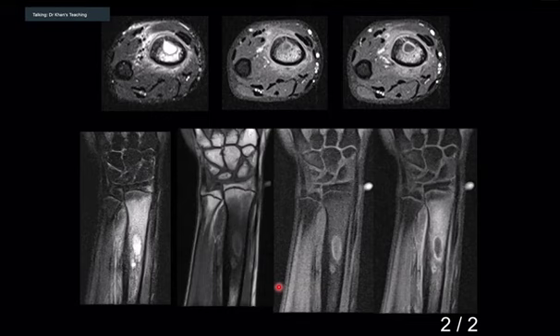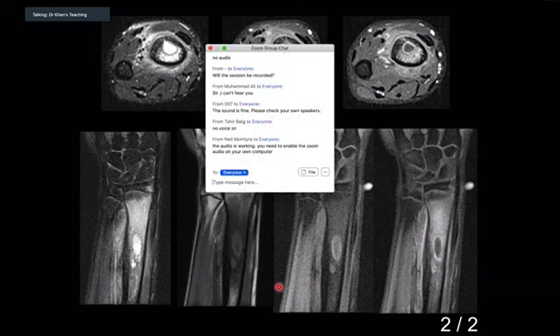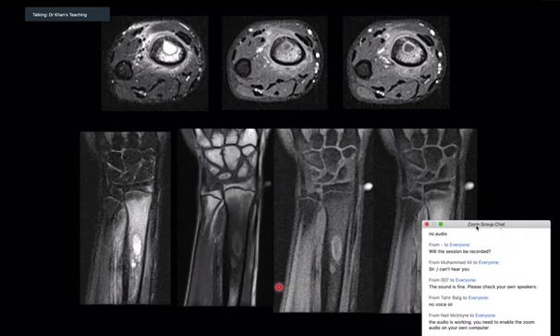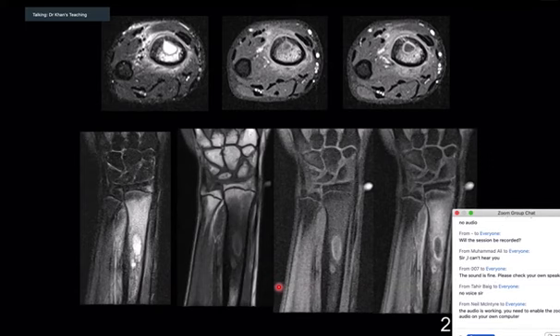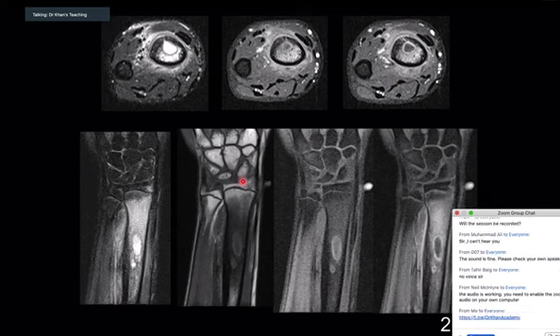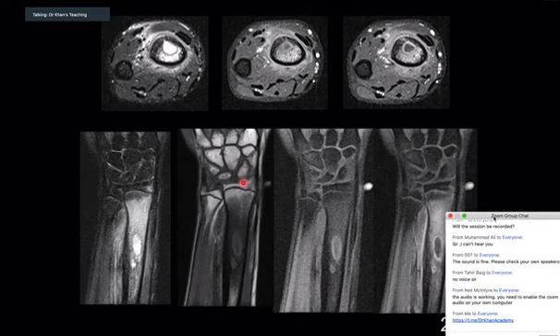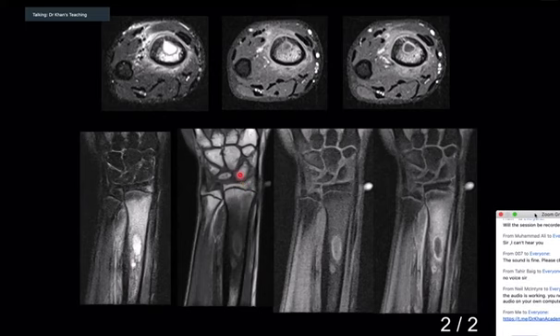You can mute yourself, candidate 1. Thank you. Now, when we do musculoskeletal imaging, we do a T1 weighted sequence. T1 weighted sequence is the king sequence to see marrow abnormalities. I'll show you MR spine also. Anything which is dark on T1 is a bad sign, because usually there is a bit of fatty component of marrow; it all depends on the age of the patient.